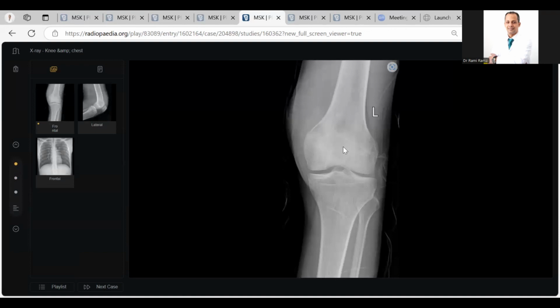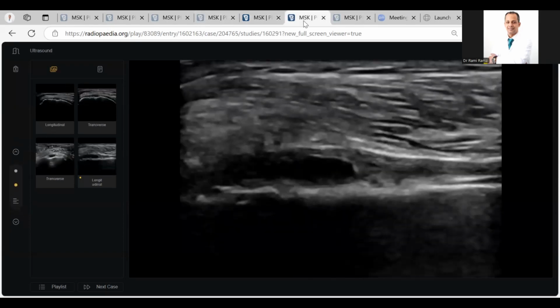This is very good. But as I told you before, when you see the bone is normal, try to detect any periosteal reaction, Codman triangle, and look again at the bone. Compare like with like. Somebody may tell me this is the patella. No, see, this is the rest of the patella, less sclerotic than this. Okay, my colleagues.